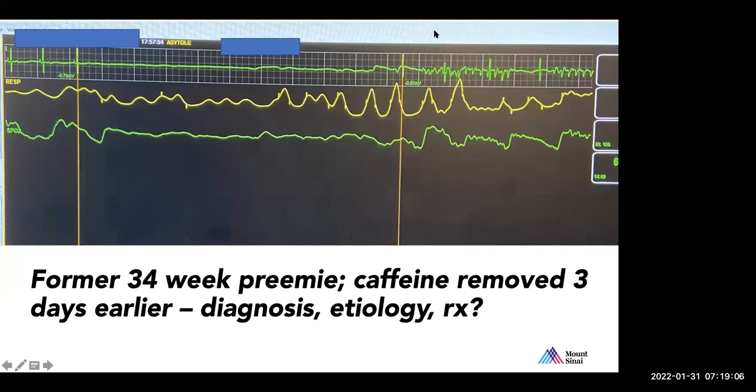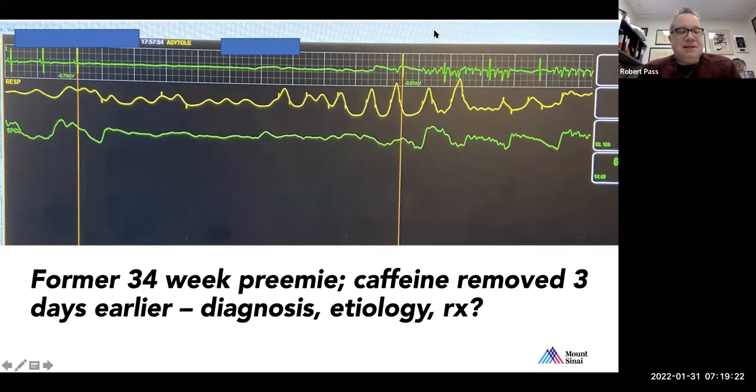Actually, no, it should be longer. Sorry. So 1 big box would be 200 milliseconds. So that would be around 5 seconds, I would say. Well, am I wrong again? It's more like 10 seconds we're looking at.